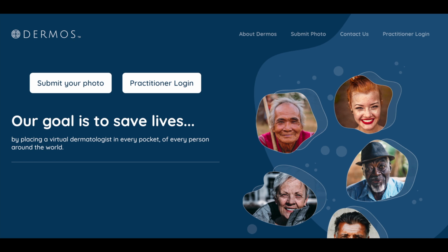Here is a short tutorial on how to diagnose various photos that have been uploaded by practices as an organizer account. There have been some changes made to the system recently where we added an extra layer of folders to organize the photos by practice. So let's dive in and take a look at that.